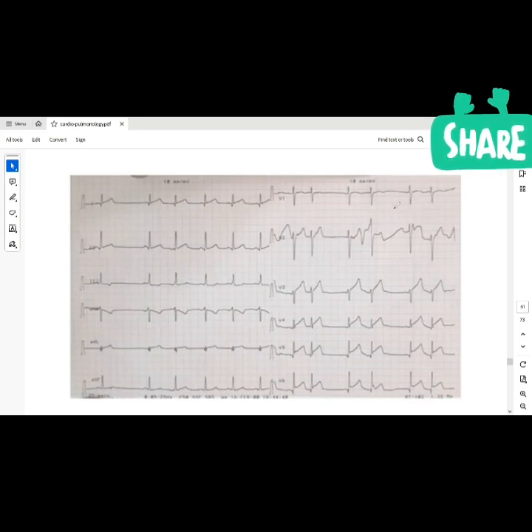But is that an ischemic change? No. So we're looking for ischemic changes. Because remember, why am I looking for ischemic change? If I give you a vignette attached to this ECG, of course I'm reading the vignette first. The vignette gives me an idea of what I'm looking for on ECG. The patient has crushing chest pain, they're sweating, they have all these risk factors of atherosclerosis, the patient is like 70 years old, etc. I'm going to my ECG thinking ischemic changes. Make sense? Because of the presentation of the person. Yeah. All right, so go ahead.